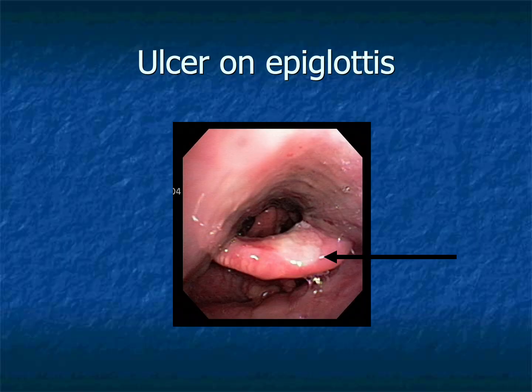This image demonstrates an ulcer on the epiglottis. Ulcerative lesions raise important diagnostic considerations, including infection, malignancy, traumatic injury, inflammatory disease, or radiation-related changes. The bronchoscopist must observe not only the lesion, but also the surrounding mucosa, whether the tissue is friable, whether there is associated edema, and whether airway patency is compromised. In bronchoscopy, context matters as much as appearance.